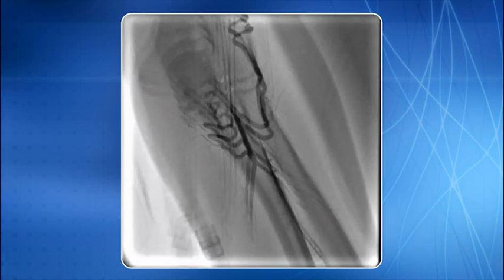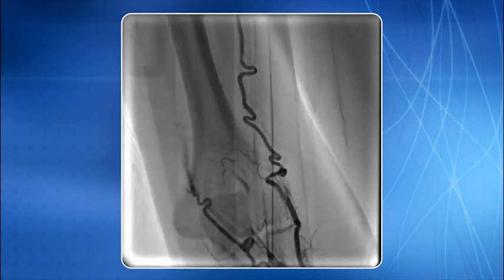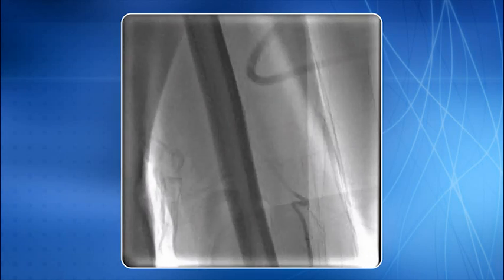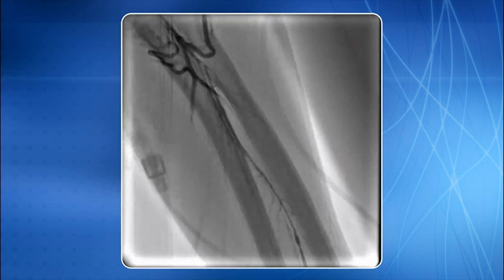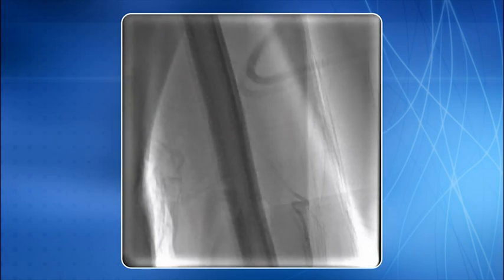This is a very interesting example. The patient himself is an anesthetist who had the habit of taking morphine. He became actually the addict, and when he spoiled all his arm veins and forearm veins, he started injecting morphine inside his arteries, and ultimately the arteries got fibrosed, and this is how they are occluded. What you see is the extensive collateral circulation which has been established after a long segment total occlusion over here.